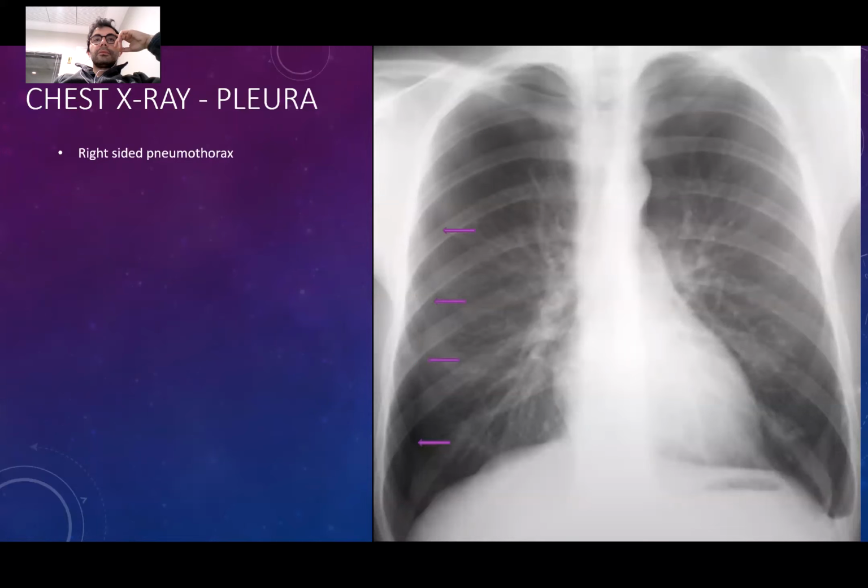Is the aorta normal? The arcus aorta is normal here, or is it quite enlarged? Enlarged? Yeah, I feel like this. Or is it because you're looking somewhere else? This aorta is normal sized, right? The size is 4 centimeters normally, but this is obviously looking normal, doctor. If you don't see it as normal, your eyes are going to calibrate it. Don't worry.